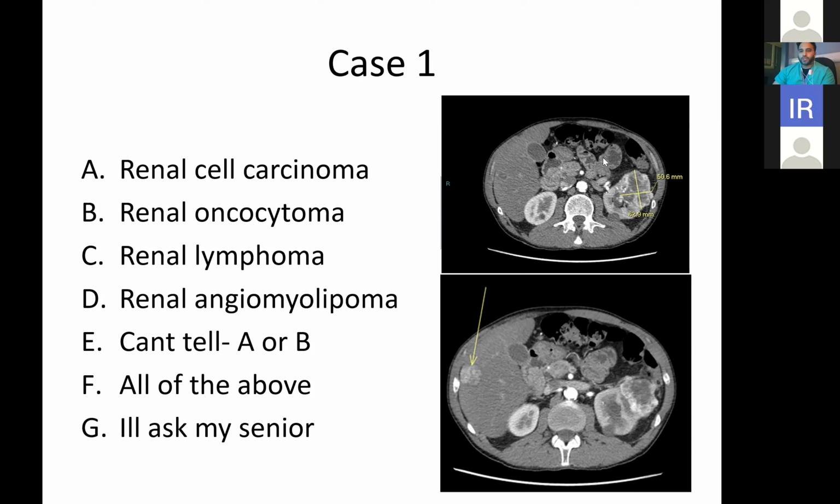So Luke, I noticed that you mentioned A as the option. Why do you think it's option A as opposed to, let's say, option B or something? Just because it's more common, maybe. I don't really know what B is specifically.